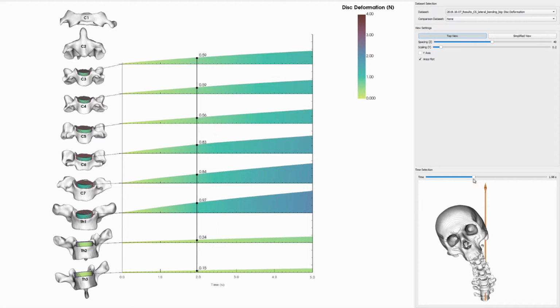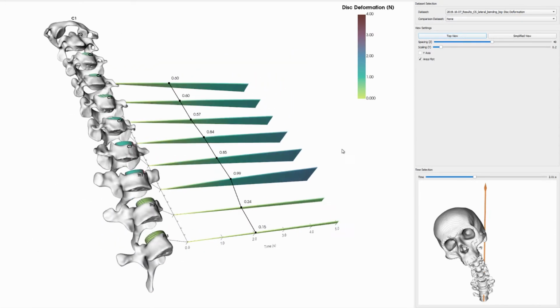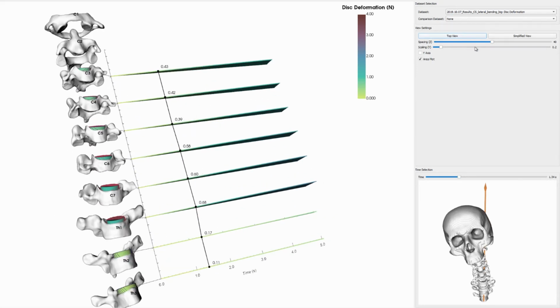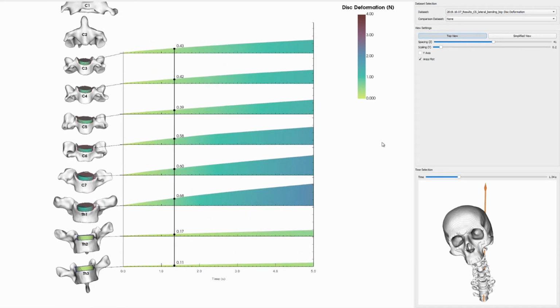The window is also interactable. Simultaneously, we indicate the selected time point in the data with this black line, and we also show the quantitative data values at that point. At any point, the user may switch between the representation modes. Settings like time, color map values, spacing between plots, and scaling of plot values, they are all shared across all views. So this is the display for a disk dataset.